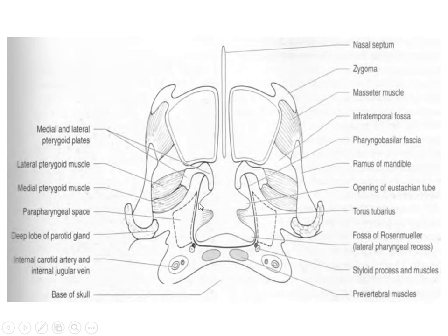This is the infratemporal space, I think. Yes, infratemporal fossa. The name is very obvious. Infratemporal: you look for temporal, below it, down to the hyoid bone.